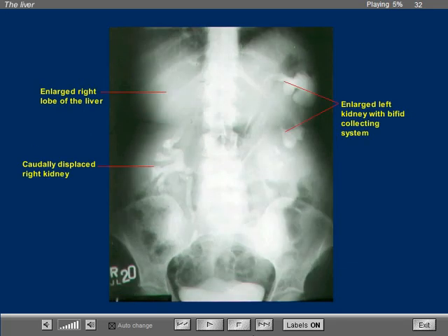Although this woman had no symptoms referable to the urinary tract, because a splenic pulp aspiration study and a bone marrow investigation were neither definitive to diagnose the cause of the anemia, a urogram was performed, and it shows that the right kidney is normal in size and structure, except that it appears caudally displaced by an enlarged right lobe of the liver.